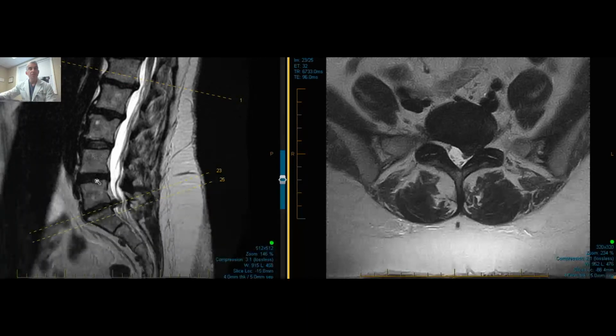Now this is considered your low back, or your lumbar spine. So this would be the first bone in your lumbar spine, this would be the second, the third, the fourth, and the fifth, and there's just 5 of them. This coming down forms your sacrum, which travels all the way down to your tailbone area. And believe it or not, these are another 5 bones, and you can kind of see some small separations, but they really are fused together, and that happens when you're in development as just a little baby.